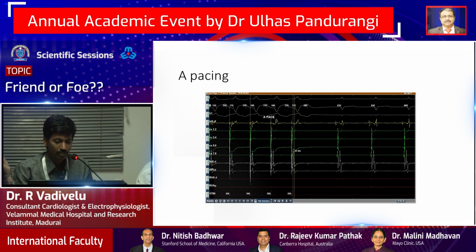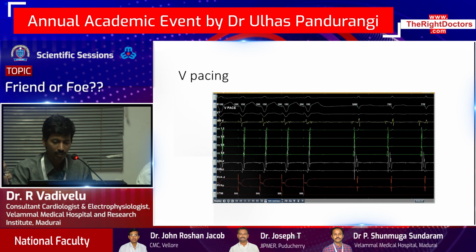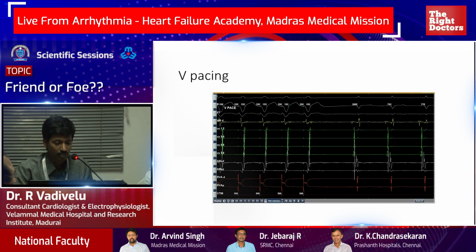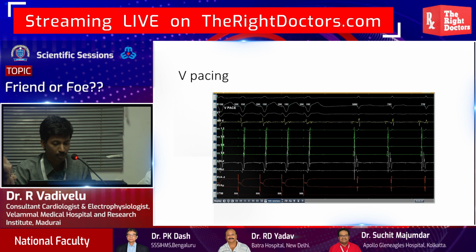This is another one, and the morphology is different. You can see in the previous slide, we have AV and in between this potential. On atrial pacing, we can see the His moved near the V, and the distance between this so-called potential is 33 milliseconds.